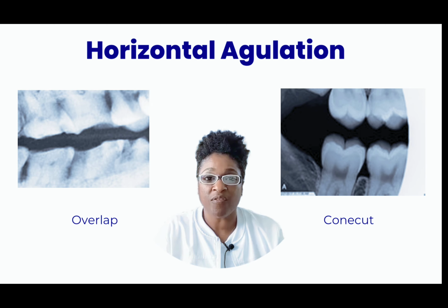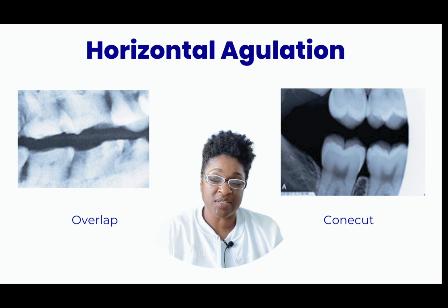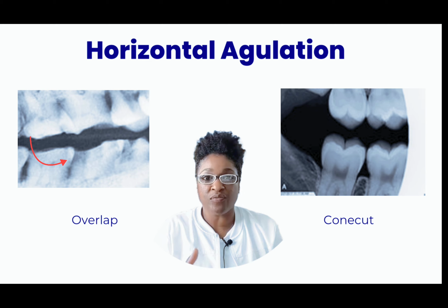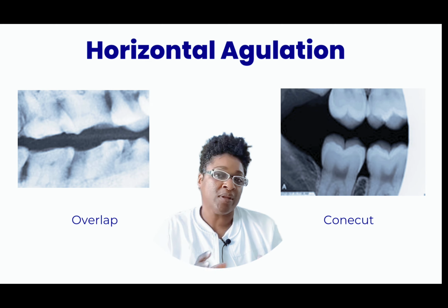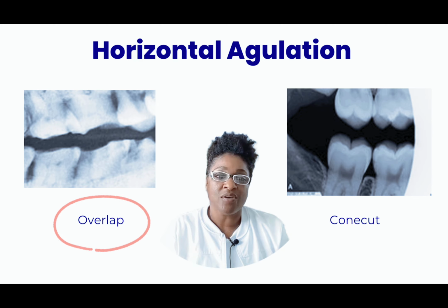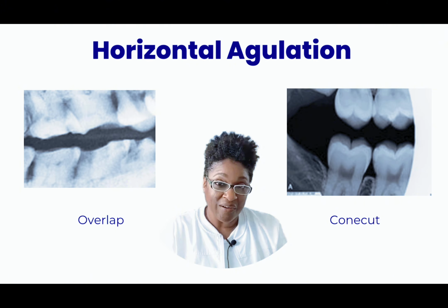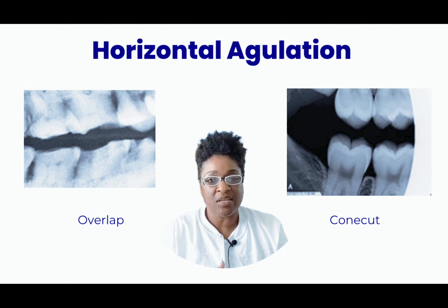And so that's what gives it that cloudy look in between the teeth. Now, that's a problem for us because if we're trying to see between the teeth, we won't be able to see that opening because the tooth, either before or after the tooth or the area we're looking at, is going to be overlapped. So, again, depending on if you have the PID pointed too far towards the nose or too far towards the ear, will result in the teeth being overlapped.